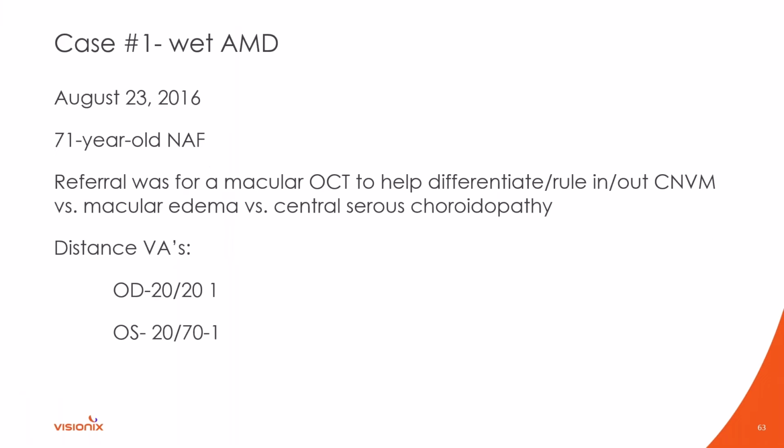Let's go through some case studies. So this is case number one. This was a 71-year-old Native American female. And I saw this patient, hard to believe, about 6 years ago, and referred in for a macular OCT. Do we have macular edema? Do we have central serous? Do we have a CNVM?